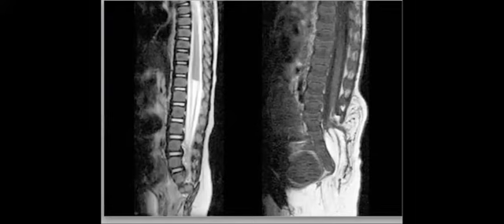And as you mentioned, there is group 1 and group 2. When you find the elongated conus with tethered cord, search for lipoma, intraspinal lipoma as here. And in type 1 you will find just the tethered cord, with the central canal maybe prominent.